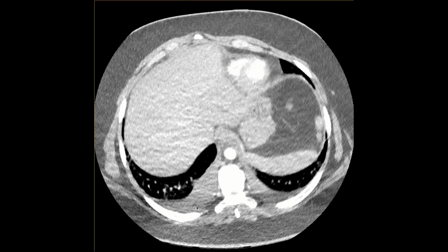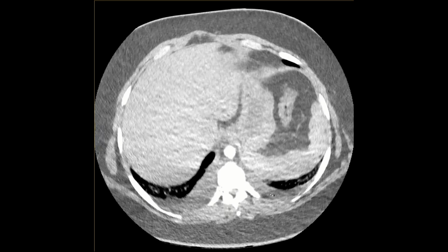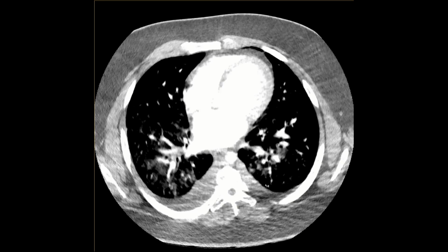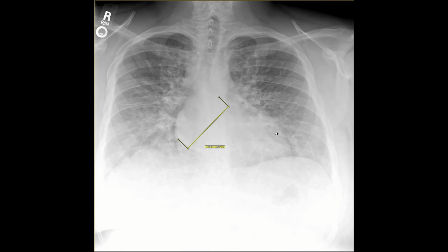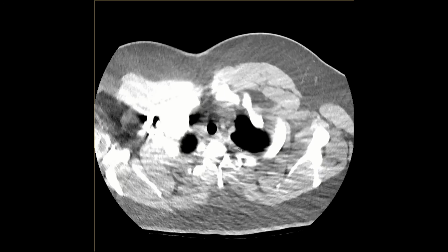This is a pleural effusion on the right, pleural effusion on the patient's left here. This patient read the book on heart failure and now has every single sign that you can imagine for heart failure. So that's why it's a great teaching case. I showed you the chest x-ray in the beginning with the double density sign, right? I showed you the lines coming out of the hilum and the perihilar indistinctness, and I showed you the alveolar edema, which we did not see on that other heart failure case.